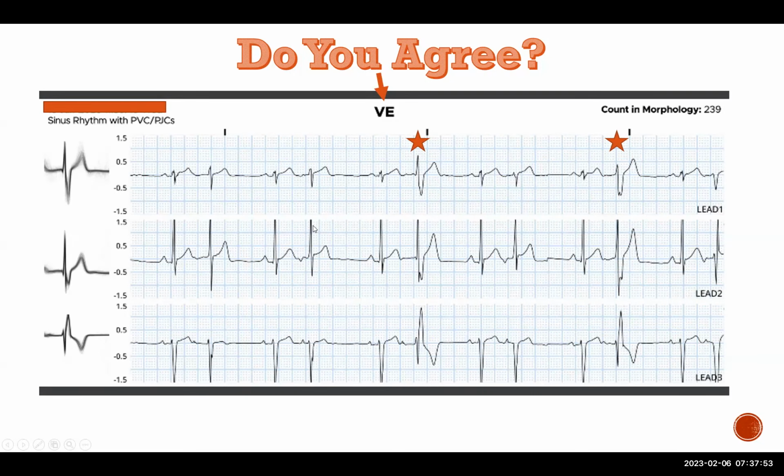So it's interesting. This is fairly premature, and the QRS is definitely a little different than the sinus beat before it. This is a similar degree of prematurity. And then this P wave is quite a bit more premature than, say, this one, and on that one, we get a lot more widening of the QRS. We also have a longer PR interval, and it's similar to this one as well. So I think this is atrial bigeminy with variable types of conduction. So these are probably our aberrated beats. These are not actually PVCs. They are aberrated PACs, I would say. Does that make sense? Yep.